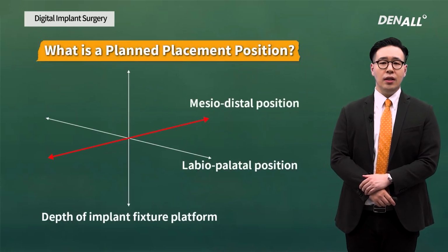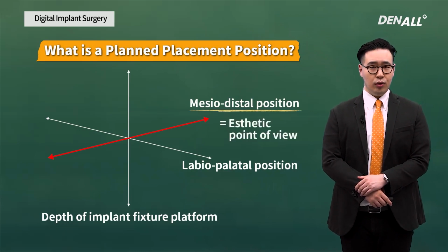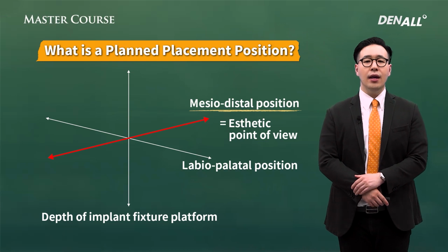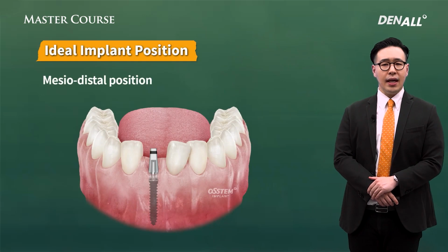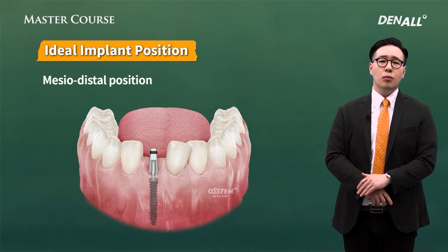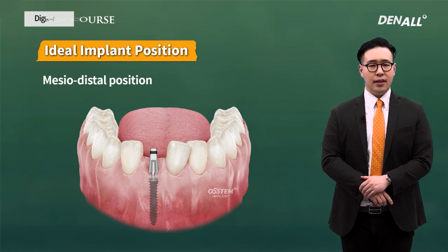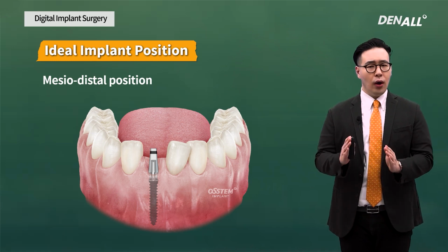Next, accuracy of mesiodistal implant positions can affect aesthetic factors. When many implants need to be placed, distance between the implants affects the implant's long-term survival. The narrowest space for implant placement can be found in the lower anterior region. In most of the cases, one-body narrow-type implants are selected. Osstem's one-guide system is very helpful in placing narrow implants accurately using the 1MS kit.